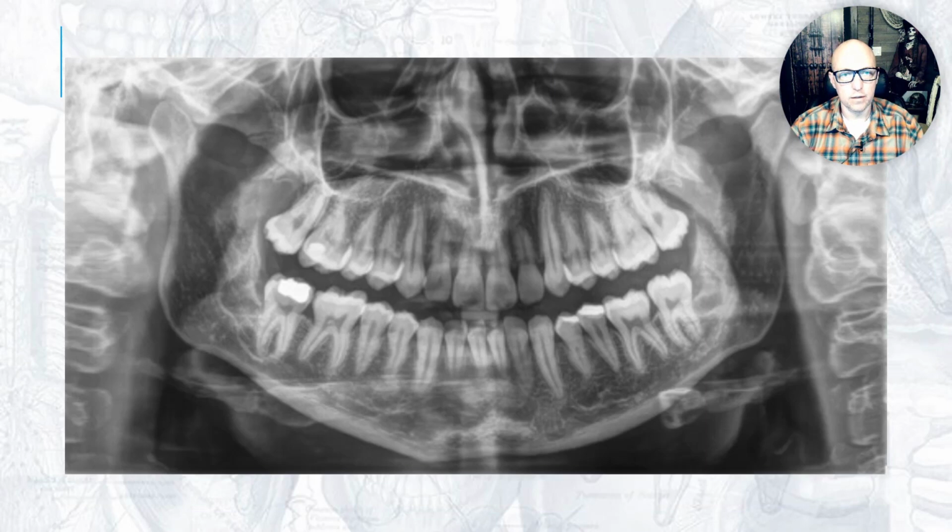This one is pretty similar. This was a good example from one of the books. Again, I would say the chin is down a little bit from what I would prefer, just a little bit of a smile line. Don't make your patients too happy. Just keep them to where they want to keep coming back. But everything else in focus looks pretty good. You got all the mandible. I could have dealt with a little less spine, but hey, that's okay.